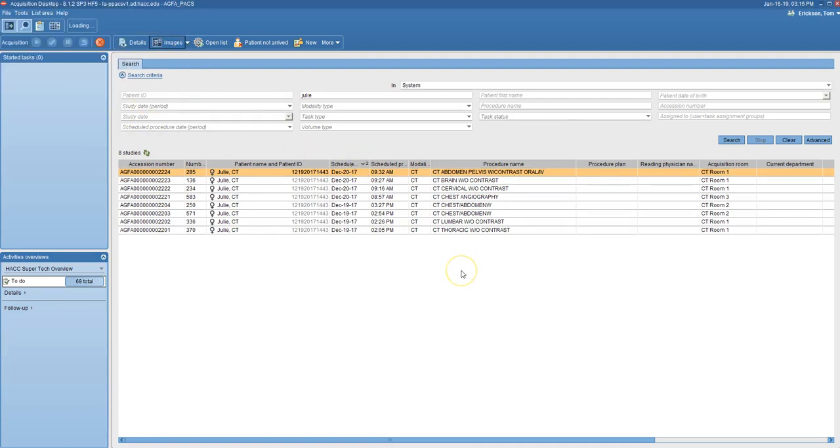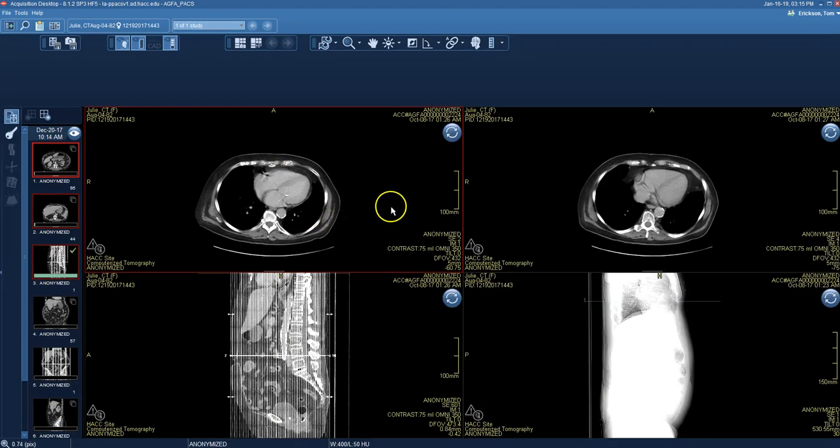No, I don't want to save any changes that I made to that. Just want my images. You booger head.